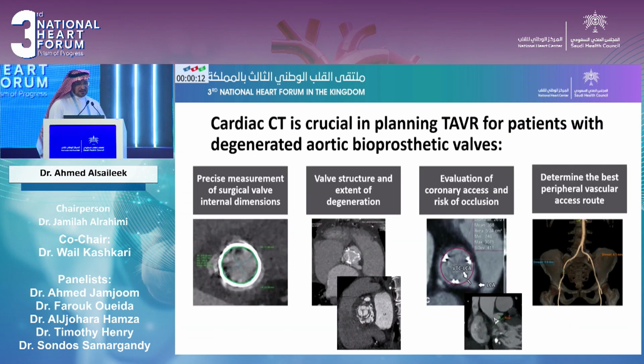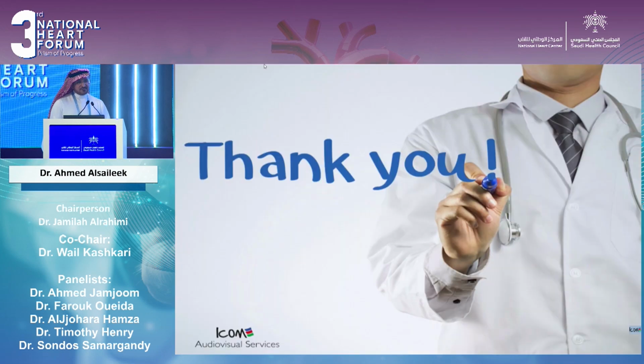So in summary, cardiac CT is crucial in planning TAVR for patients with degenerative aortic bioprosthesis in terms of precise measurement of the surgical valve internal dimension, valve structure, and the mechanism of degeneration. And we can also assess the whole aortic root and the access.